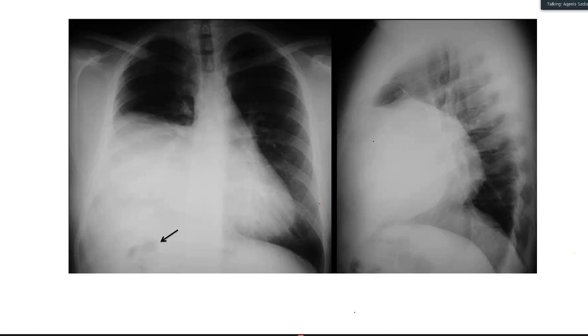Sir, I can give possibilities like there could be some below-the-diaphragm pathology like an abscess or something that could have further aggravated the diaphragm. Fair enough, but you mentioned eventration. You remember? When you say eventration, you cannot go straight away to an abscess. If I'm pointing to a lucency, it's bowel. Let's say it's not an abscess. There is no history of fever. You say the patient has come only for a pre-operative radiograph. I did not mention the patient has fever.